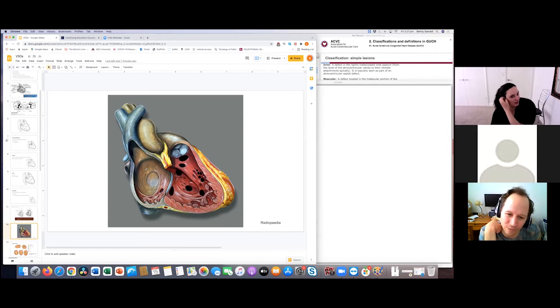There. So then what were we saying? That looks somewhere between muscular and mid. Mid, yes, mid. Mid muscular, exactly. And how about this one right under the outlet?